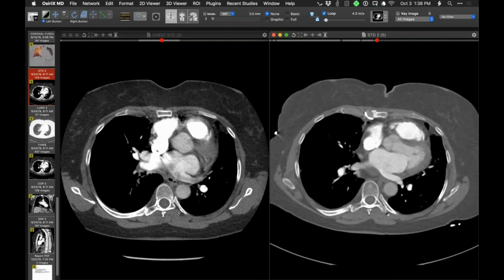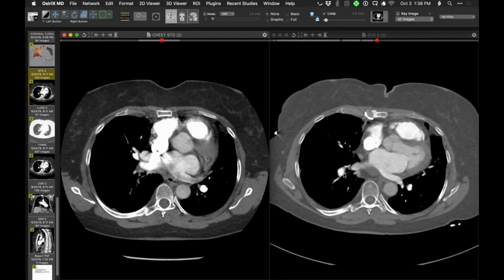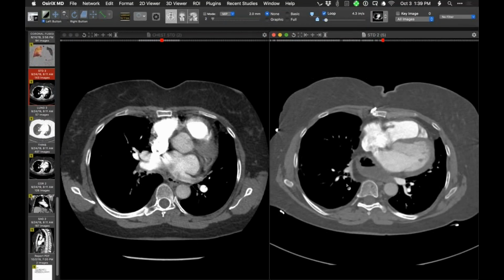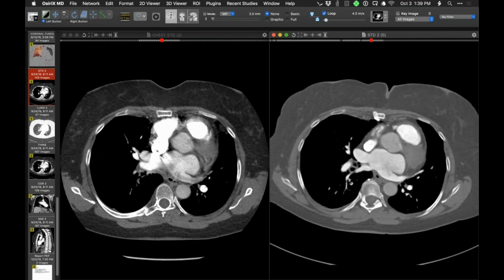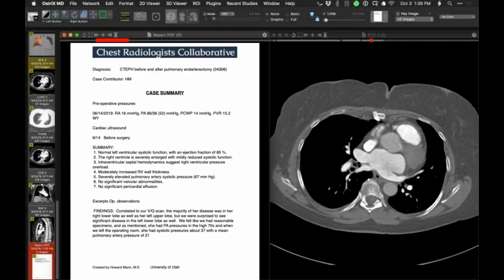So here we are, and the surgeon really opened up that area, particularly that area, really nicely. So we have nice perfusion there. And other areas were also opened up. So let's see what we have here. Here you can see some excerpt from the op report. They saw the disease, they went in, they did endarterectomies.